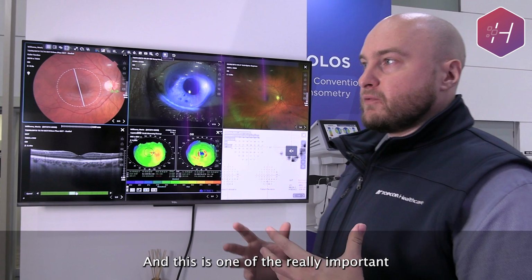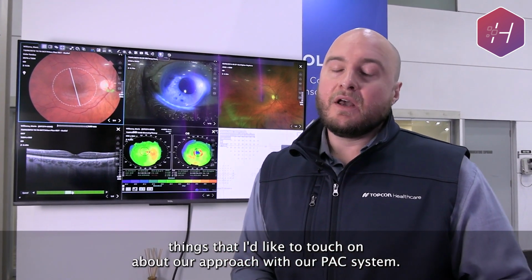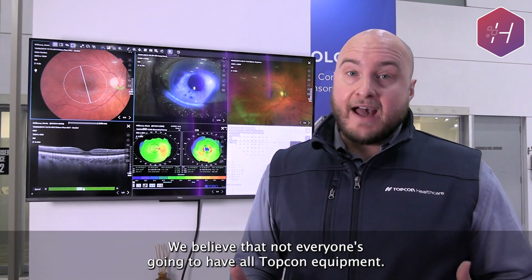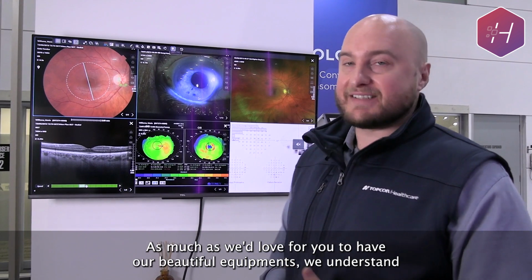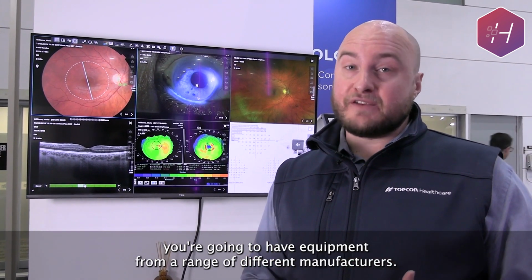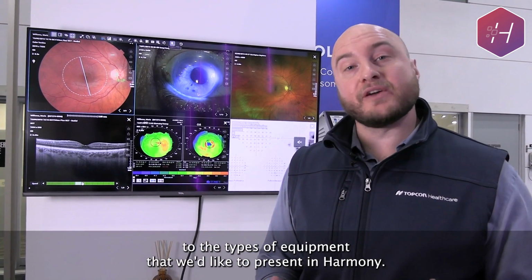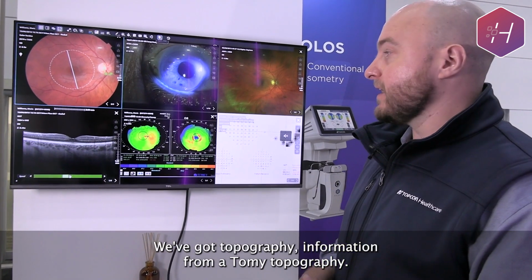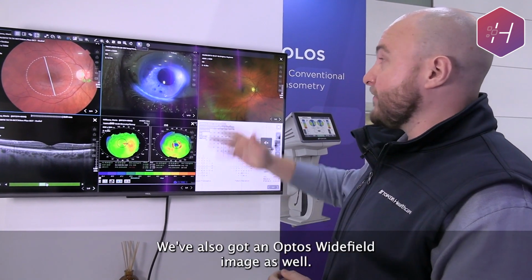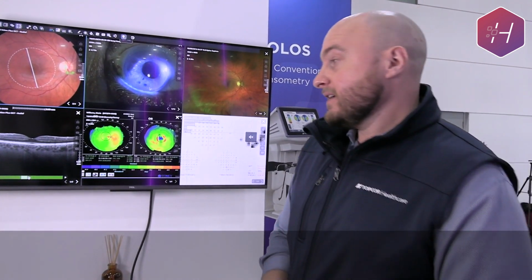This is one of the really important things that I'd like to touch on about our approach with our PACS system. We believe that not everyone's going to have all Topcon equipment. As much as we'd love for you to have our beautiful equipment, we understand you're going to have equipment from a range of different manufacturers. So we've taken a very agnostic approach to the types of equipment that we'd like to present in Harmony. We've got a Haag-Streit slit lamp here, topography information from a TOMEY topographer, an Optos wide field image as well, and a Zeiss HFA.